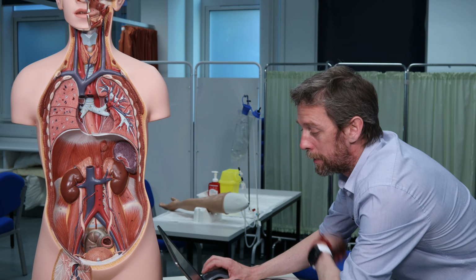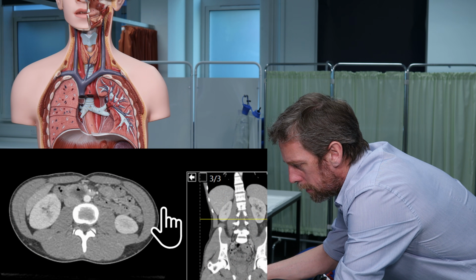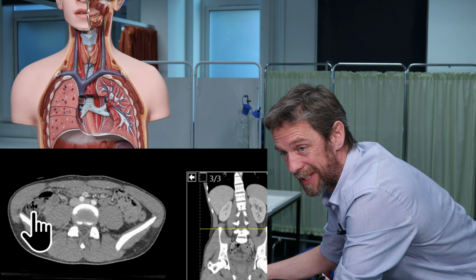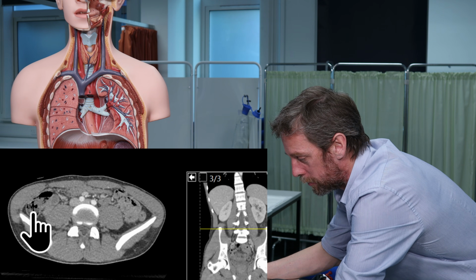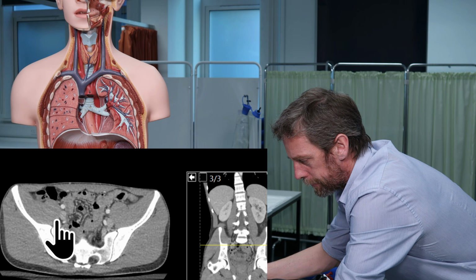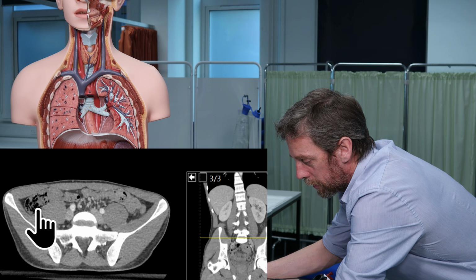Anyway, right, okay, so the other things we should be looking for are small intestine and large intestine. So, as we scroll down, there's not a lot of room left in here, is there? If we scroll all the way, okay, so we know that the cecum, the start of the large intestine, is low down on the right side of the abdomen. So here we are, right side, low down. So we can see the cecum forming here, and it's got some gas, some air in there.